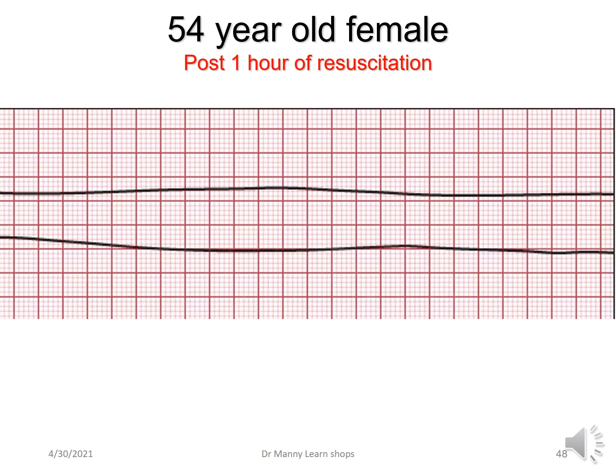Now you've got a 54-year-old female who, after 1 hour of resuscitation, the doctor said, let's just stop and have a look at what the rhythm is. This is the rhythm. Or this is not the rhythm. This is asystole.